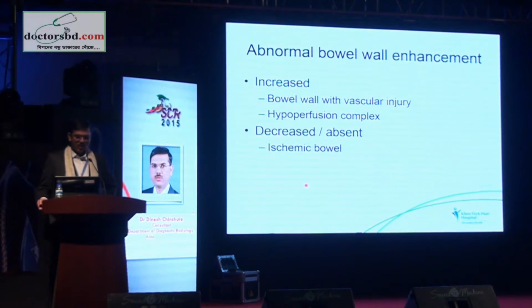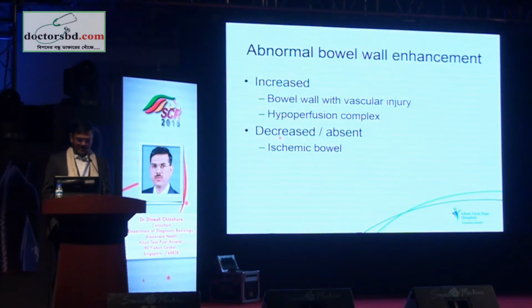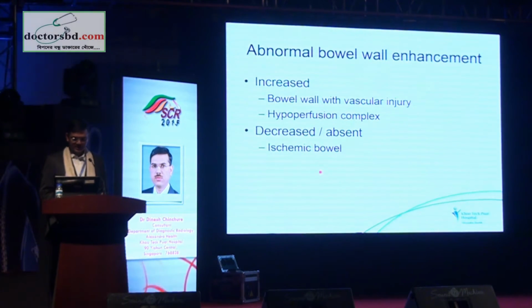Next, coming to the abnormal bowel wall enhancement is again quite common. It can be either increased or decreased enhancement. The increased enhancement is because of the bowel wall with a vascular injury. Hypoperfusion complex, there is the increased enhancement. Decreased or absent enhancement is in the ischemic bowel.